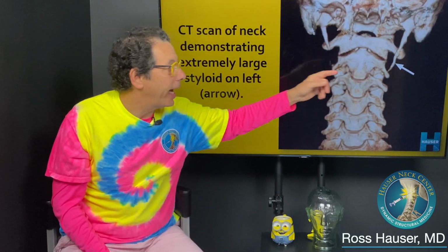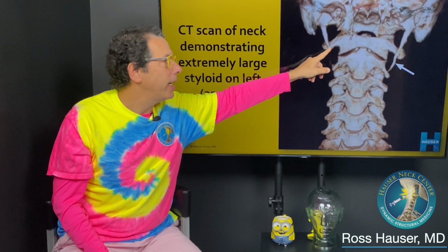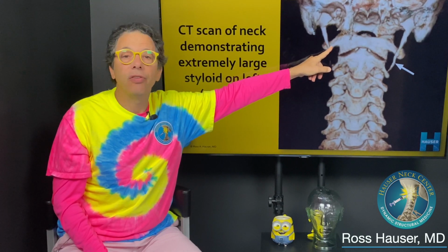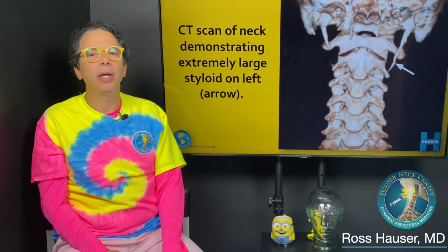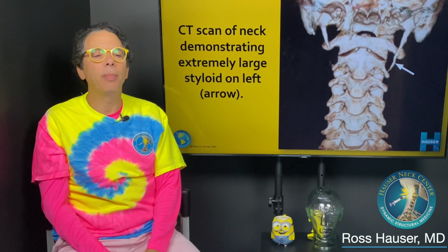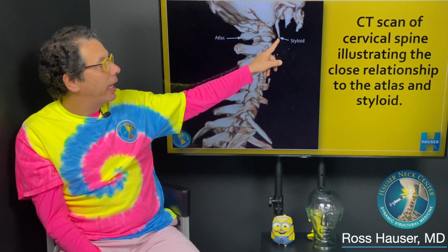Look at that styloid. You can definitely see the styloid can go to the level of the atlas. The styloids are not supposed to go to the level of the atlas because the jugular vein goes between, in most cases, the styloid and the atlas. So the styloid bone is not supposed to go to the atlas. So see that little space there?